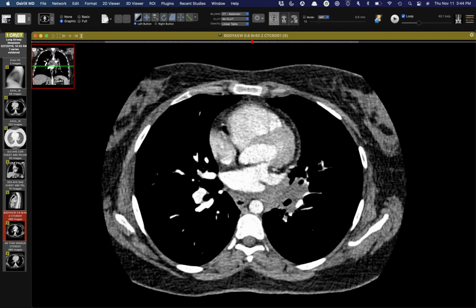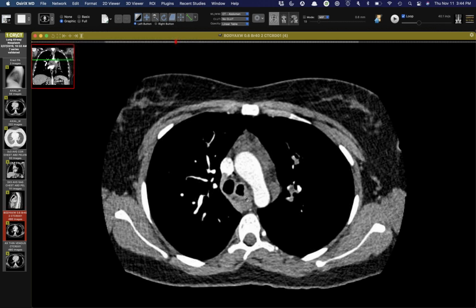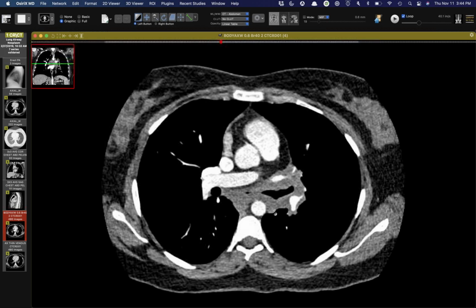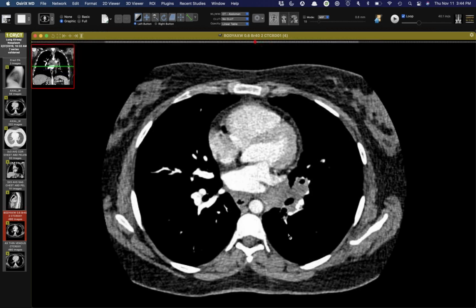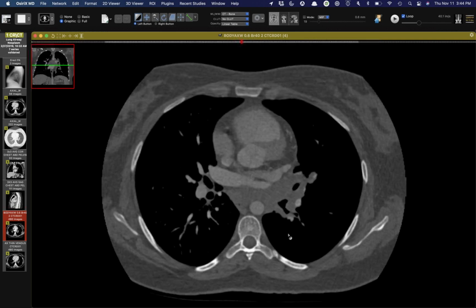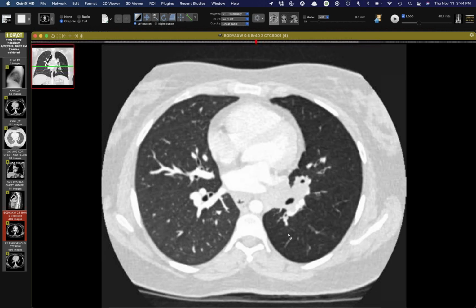And this is all a big plexiform neurofibroma involving her tracheobronchial tree. That's been proven on multiple biopsies when they've tried to debride this thing. And so she has NF type 1. That's crazy. Oh my word. I don't think I've ever seen one grow in this pattern before.